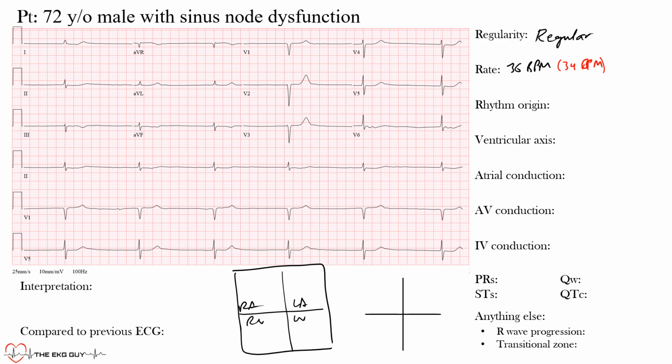and left ventricle, our atria up here that produce the P wave, and we're saying there's no P wave present, so it's not coming from the atria. And then we have normal QRS complexes, which are from the ventricles, so likely not originating from here, and therefore it must be originating from somewhere between, where that AV node or junctional rhythm takes place. So that is likely where this complex is originating from, so we'll call this likely coming from the AV junction. Hopefully that makes sense there.